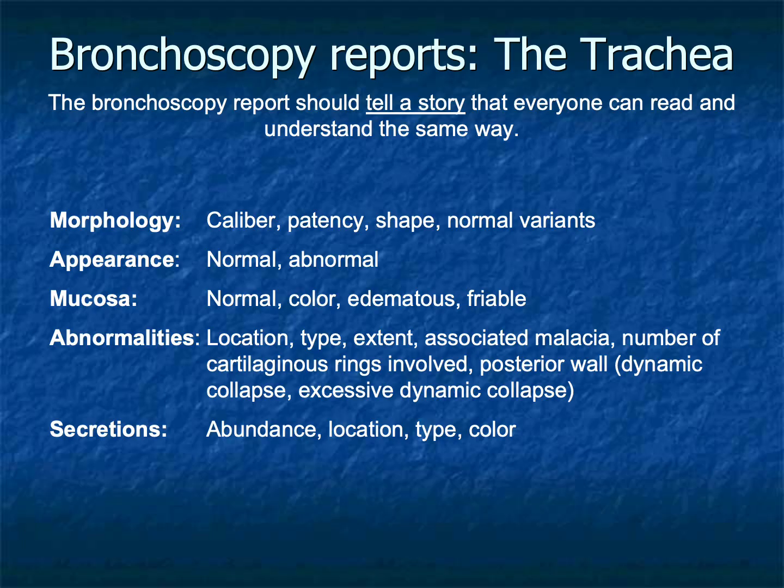When describing the trachea, begin with morphology, comment on caliber, shape, patency, and any normal variants. Next, describe the appearance of the mucosa. Is it normal, inflamed, edematous, friable, infiltrated, or otherwise abnormal? If pathology is present, specify its location, extent, and character.